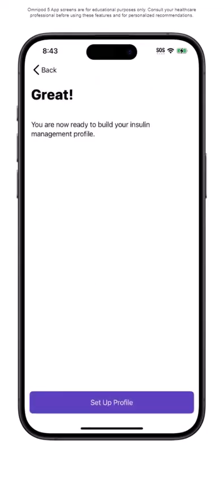The app also guides you through entering your initial pump therapy settings. Different systems work differently, and the settings that you currently have may need to be adjusted. Your healthcare provider will determine your initial settings for Omnipod 5. Do not calculate settings on your own. You'll need those settings as you'll enter them when you go through the next steps.